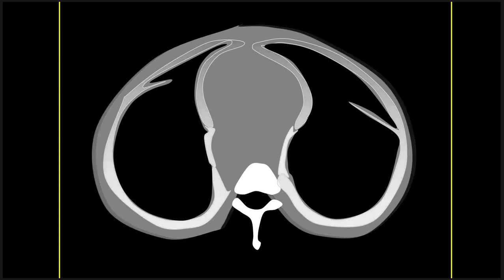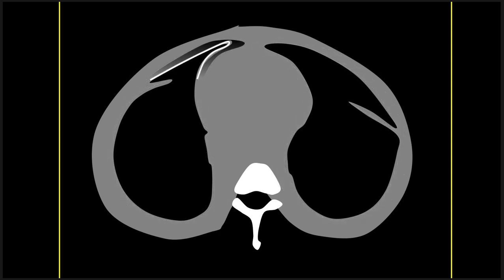And what do I mean by abnormal? Well, if it's got fluid in it, layering like this, that would be a pleural effusion, right? Or if it's got air in it, which would rise to the top, that would be a pneumothorax. In which case, not only would we see some extra black stuff, we'd probably also see that sharp pleural line, that black, white, black, and we'll talk more about that in our next lecture, which will be concentrated on the pneumothorax.